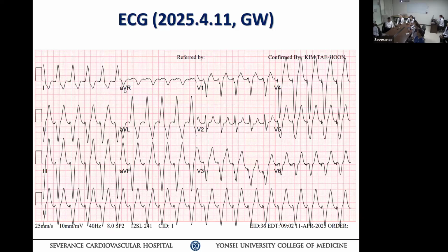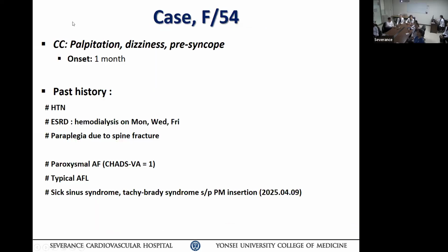Okay, please proceed. This case was a female, 54-year-old patient. Okay, hey, go back to the EKG, guys. Can you guys hear me? Go back to EKG.